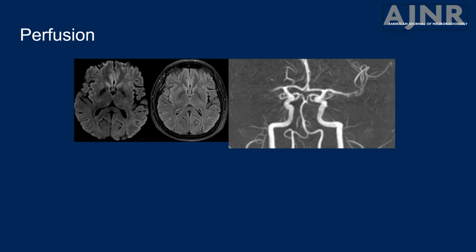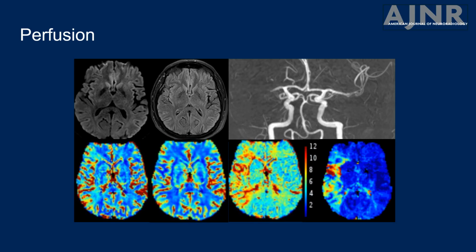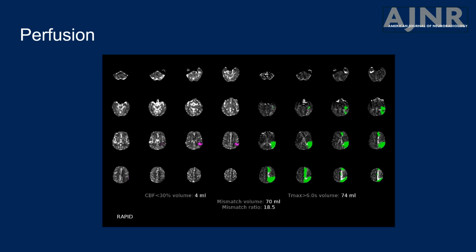Some of the key findings in perfusion imaging are the matched defects in CBV and MTT that suggest an infarct core, or the prolonged MTT with preserved CBV indicating ischemic penumbra. Usually in early stroke stages, the extent of regionally abnormal MTT often exceeds that of abnormal CBV and CBF. These maps show smaller areas of abnormality than MTT, making them more specific for ischemia and infarction. Mismatch between abnormal CBV and CBF can help us in estimating the penumbra.